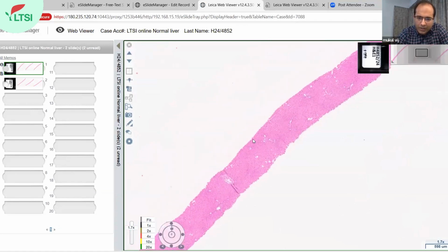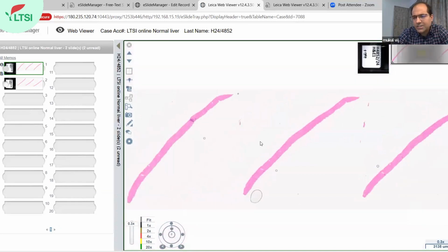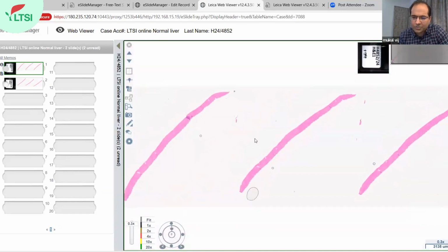This is working for me. Okay, so let's go to the next one then. Yes. This is a biopsy from a donor. Normal liver we are not going to get, so we sometimes get biopsies with some issues, either enzymes slightly raised or some antibody positive, and so they do a biopsy to look for it, and sometimes for fat also.